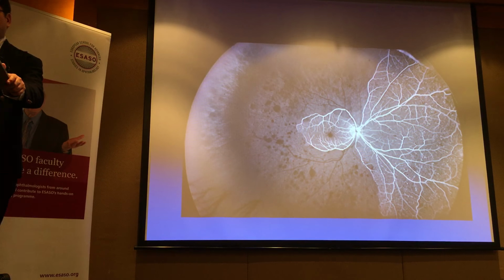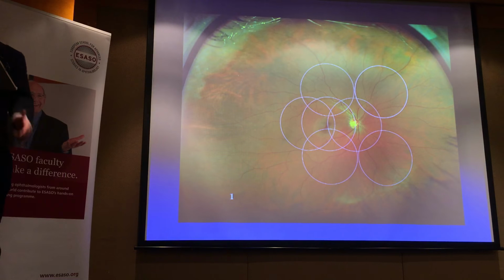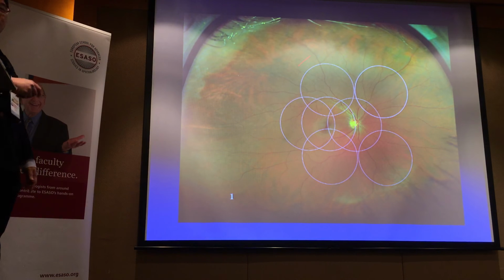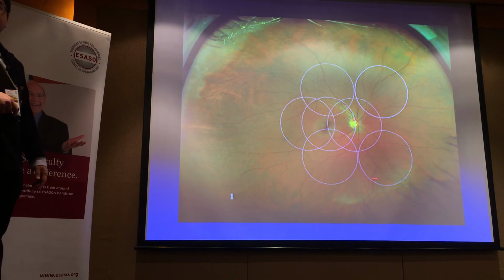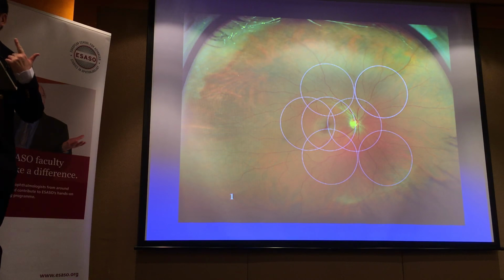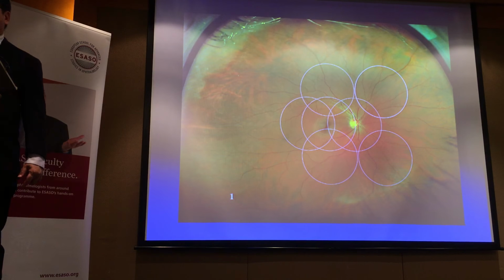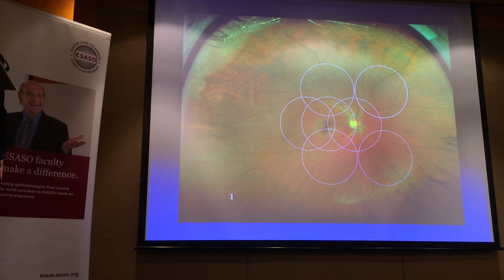Okay? And again, I know we're deviating a bit, but remember that for the retina, there's a lot more to it than even the ETDRS 7 fields. And your OCT scan covers this region. You can try and steer if you've got a cooperative patient, and in this case, you would definitely need a dilated pupil. If you think there's something here, look for it. Okay, you can, but be careful. That's one of the limitations of OCT. Okay, it's even a limitation, frankly, of examination.